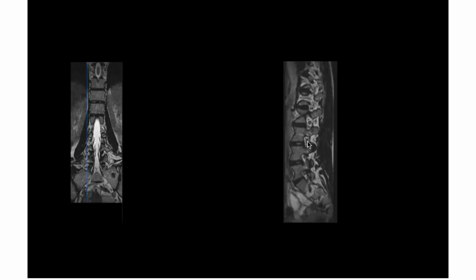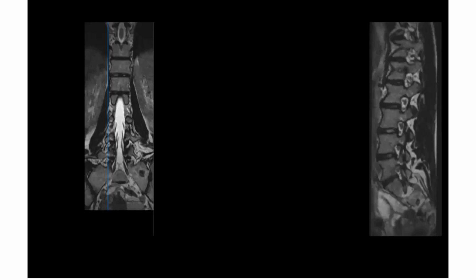Suppose there is a herniation over here, and you see this fat around the root, which is clearly visible. That means herniation is there, but it is not sufficient to compress the nerve. But if there is herniation over here, and the nerve is pushed upwards, and there is no fat around here, that means this foraminal herniation is compressing the exiting root. Understood? So can you please come again?